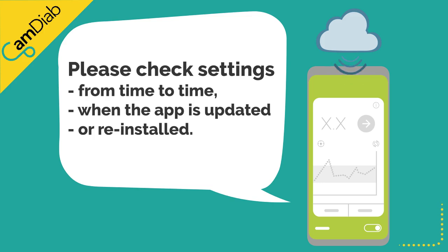It is worth checking all your MyLifeCam APS FX settings from time to time and especially when the app is updated or reinstalled.